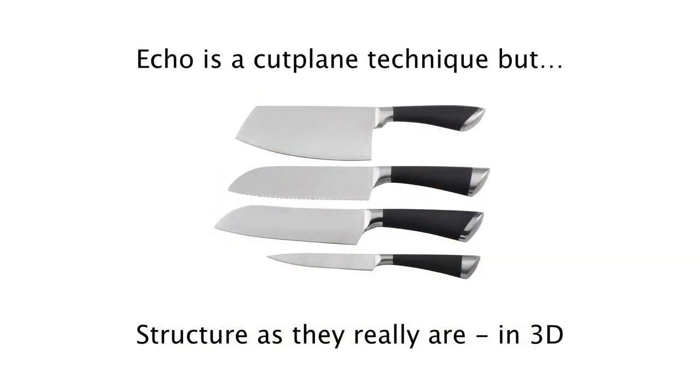Thomas, we've seen really nice examples of views and aortic valves, but is it always so easy to get these views? Well, honestly, not always, because after all, it's a cut plane technique, and we have to sweep back and forth to find the area where you find the leaflets opening or not opening and where the calcification is. But Anna, I think you have something to show us, which is very spectacular. I would like to show a 3D image of the aortic valve, which actually really resembles the aortic valves we saw already in the movies.